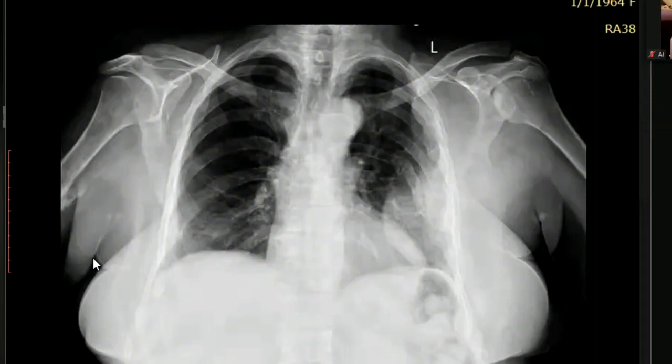I have the CT scan, but can you see any other abnormality on this X-ray? Sure. So when you look at the X-ray, you have seen that there is something in the left lung pleura, right? Yes. And you thought that it is aggressive. So what other structures do you look at? I am looking at the bilateral breast shadows. Okay, you have seen the breast.